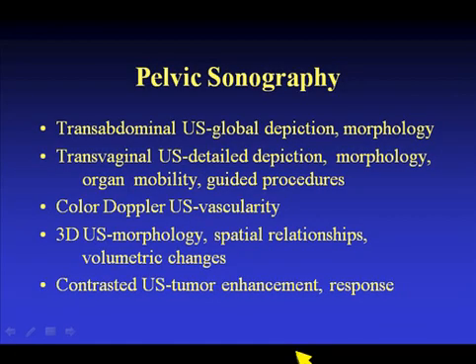So what I've tried to do in this talk is give an overview of the use of various sonographic techniques in evaluating patients with pelvic masses, emphasizing the use of transabdominal to look at the global depiction, transvaginal to get the details, color Doppler to look at the vascularity, and 3D to look at morphology and volumetric changes, and finally the potential use of contrast for evaluating tumor enhancement and response.